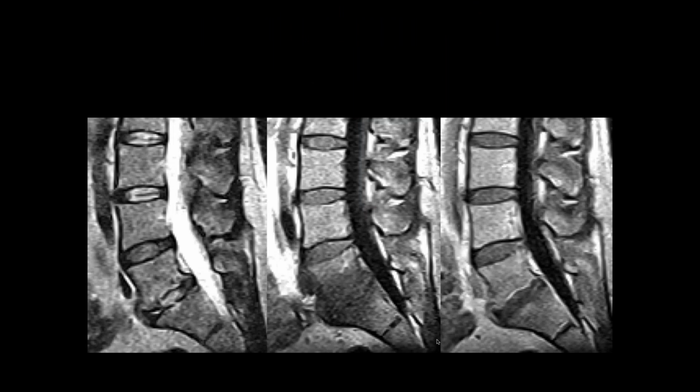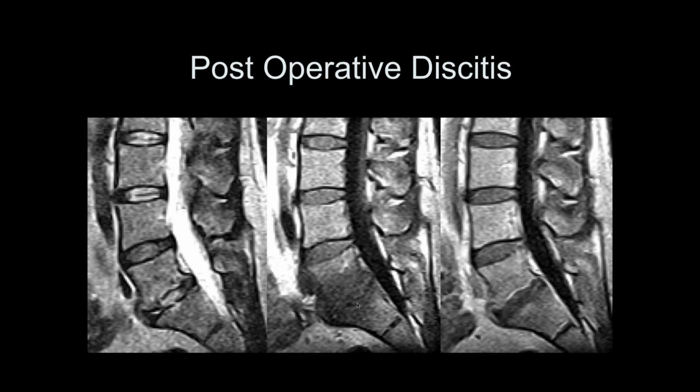Okay, we have abnormal signal involving the end plates and disc space at L5-S1. This patient had recent surgery. Okay, in the back. So I don't see post-op changes at this level. So on the T2 we can see definition of the end plates. On T1 we lose it at this level anyway. Again, that's very suspicious. We have loss of the fat signal here, and this was a post-op, this kind of disc.